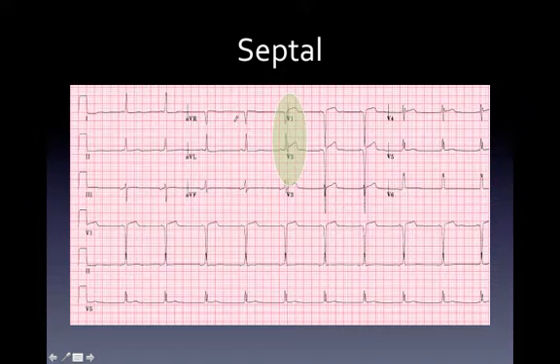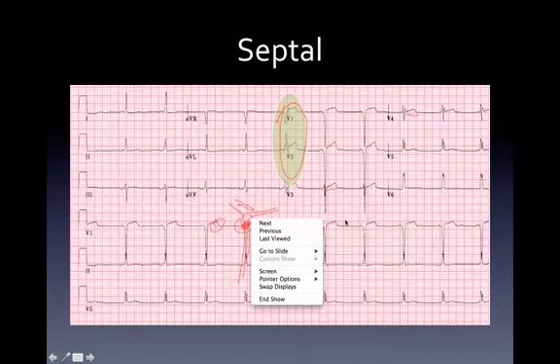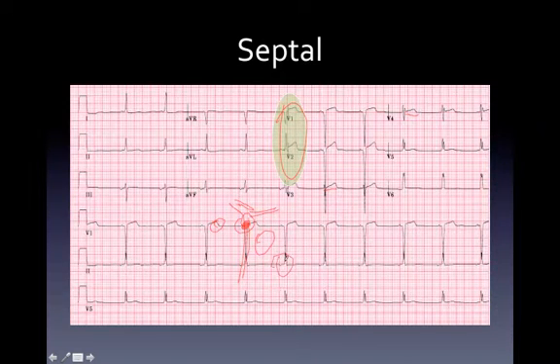Septal wall is represented by V1, V2. These are real 12 leads, so sometimes it's hard to find someone without an anterior section. And the reason being is because the left main and then the LAD and the circumflex are essentially your arteries on the left side. So if I have an occlusion in my LAD, I would affect the zones V1, V2, V3, and V4. All of that, this entire V1 through V4, is fed by the LAD.